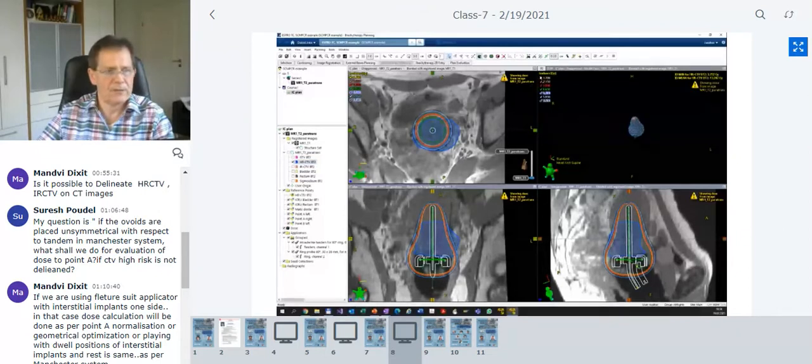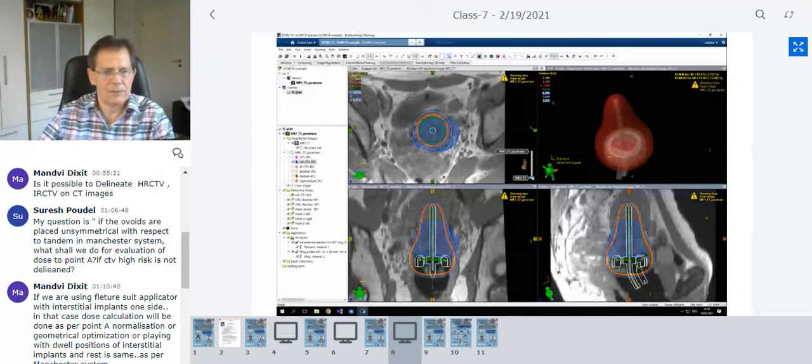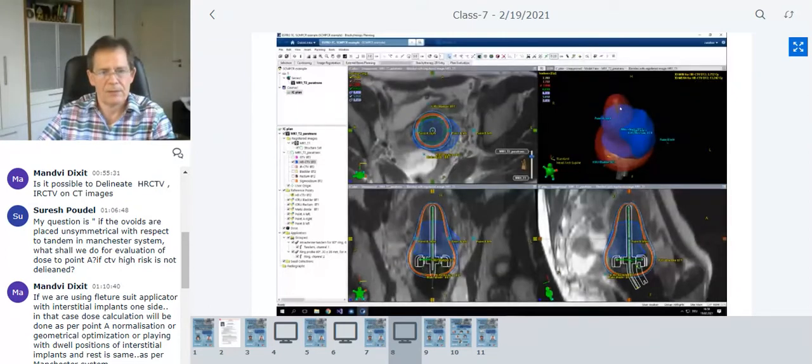We can also look, of course, at the 3D representation here. Just activate the prescription dose. So we see the applicator here. And if I would switch here to my T2 base planning, you see also the target. I could copy these targets into the other data set, so the structures, but I just keep it like it is, like this here.